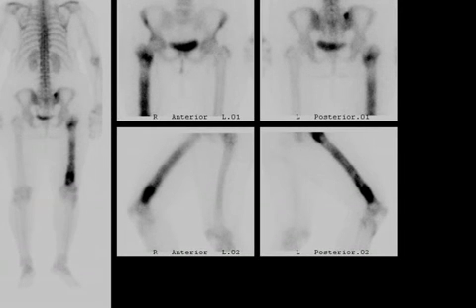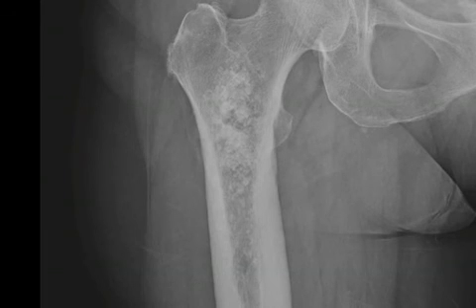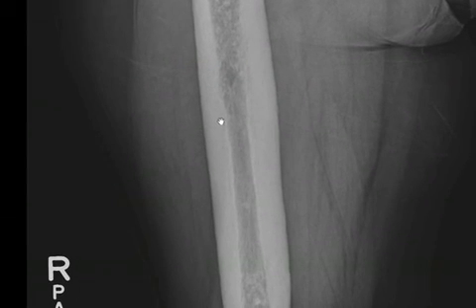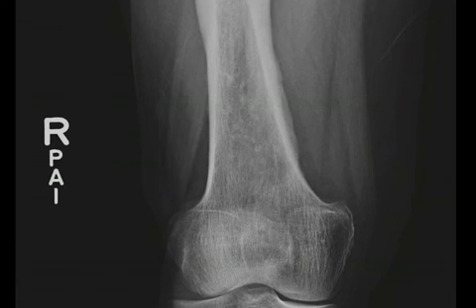If we go back to the plain radiograph on this patient, again we come back to the idea that we're dealing with a mixed lesion, sclerotic foci which have a chondroid type of an appearance, but also with marked cortical thickening distally, some cortical endosteal scalloping in the mid-femur, and a lesion that continues down the bone considerably. In the distal femur, both radiographically and on the MR imaging, we saw evidence of periosteal reaction, which again tends to lead us towards a more aggressive process.